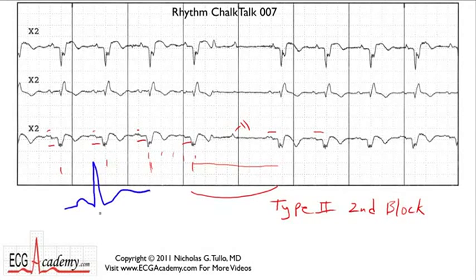You've got this P wave that has high frequency signals because it looks kind of spiky, and then you've got T waves that have a very low frequency signal content, and it looks very smooth. And if you look at these T waves, they look very smooth. And you see this one here. Now, what's interesting is there's something kind of in the tail end of that T wave. And if you look at this lead, this T wave appears to have this particular shape. I don't know what you might call it, a biphasic shape. And then this T wave, the shape kind of changes a little bit. It kind of goes up a little at the end.